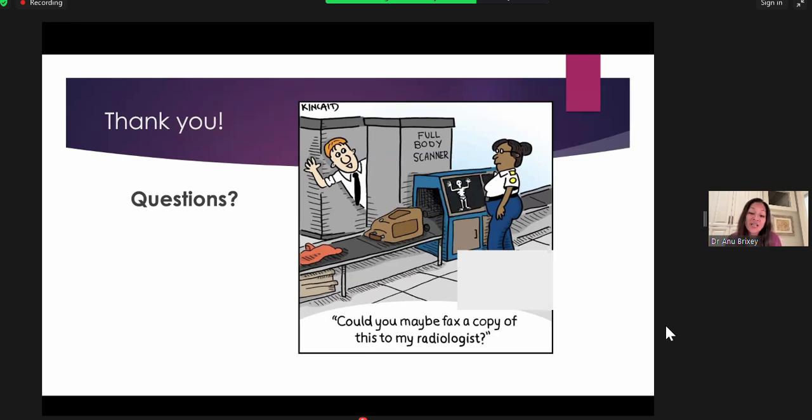And so you may not be able to tell for sure, well, do I have acute on chronic right heart strain? But typically patients that have chronic right heart failure, and they have a pulmonary embolism, they're already going to be at a higher risk of mortality. So those patients you wouldn't want to discharge either way. But looking at that pulmonary artery can help you differentiate it. But in terms of answering your question, tricuspid regurgitation is kind of the most common situation in which we see. And often those patients may have underlying chronic liver disease as well.